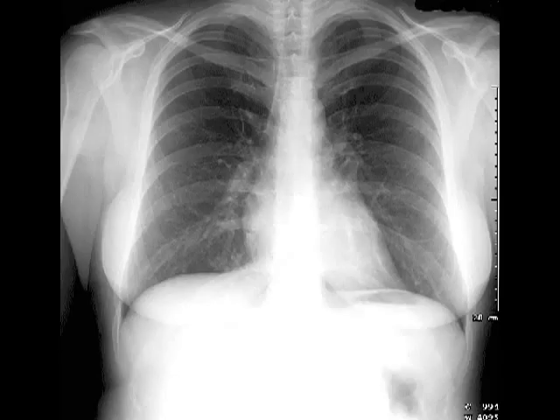A good position is one that at the top shows the entire T1, rib 1, and the apices of the lung, and at the bottom the entire costophrenic angle, or where the costophrenic angle should be, exposed. I would have liked to see the x-ray in this picture moved up a hair because we see a lot of the abdomen, which we don't need, and we cut through what looked like T1 at the top.